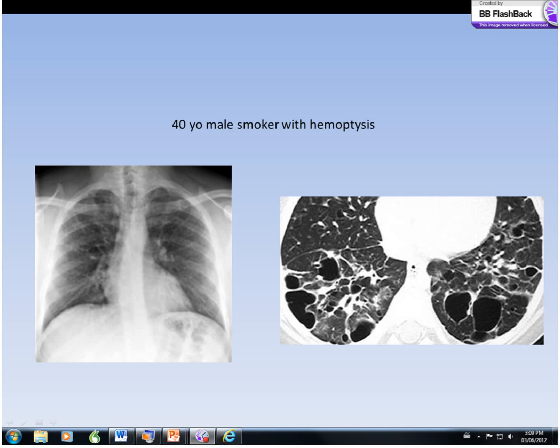And in this patient, there's many examples of that. You can even make the argument that maybe some of the areas are greater than 4 millimeters and could be close to falling into the cavitary category. But for argument's sake, let's say it's just cystic disease. I throw up the X-ray because this is what cystic diseases look like on an X-ray.